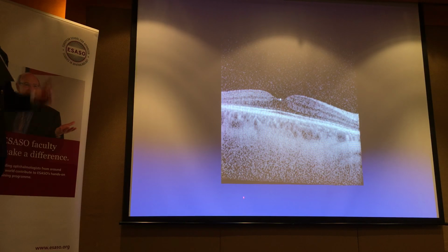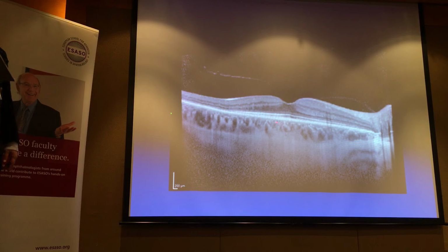But actually, if you look carefully, very carefully now, with 20/20 hindsight, right? But no, I would not have called it. I would have attributed this to a bit of poor quality in the periphery of the scan, wouldn't you? I mean, seriously, honestly, even in 20/20, who would call this abnormal? Think about it. You wouldn't, right? Honestly. But this is what happens when you get a wider scan. So, of course, you need to know what you're looking for, but be careful. If you get a narrow scan, you're going to have potential limitations.